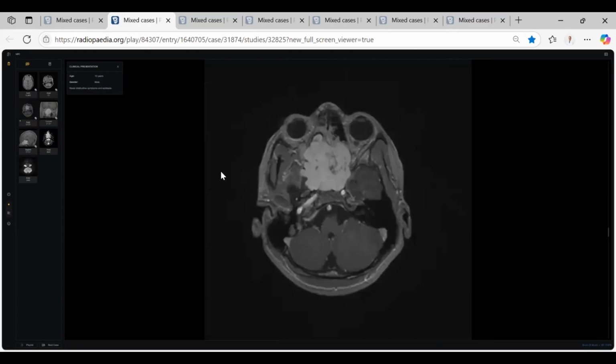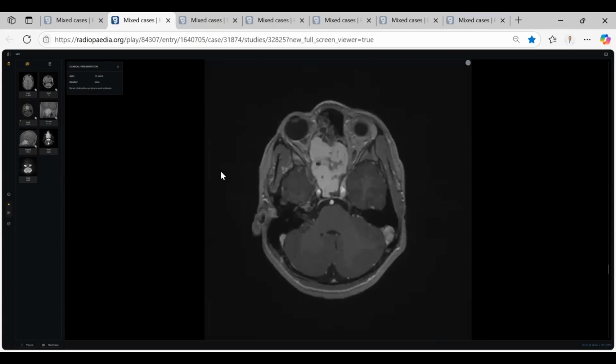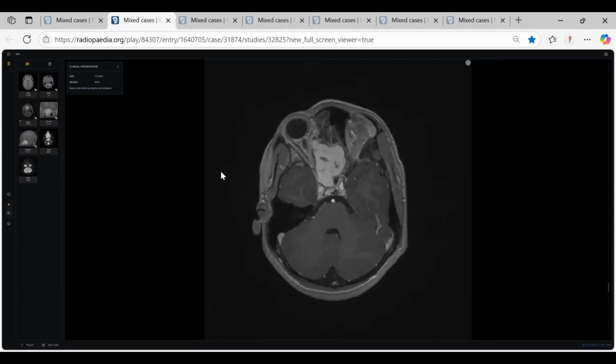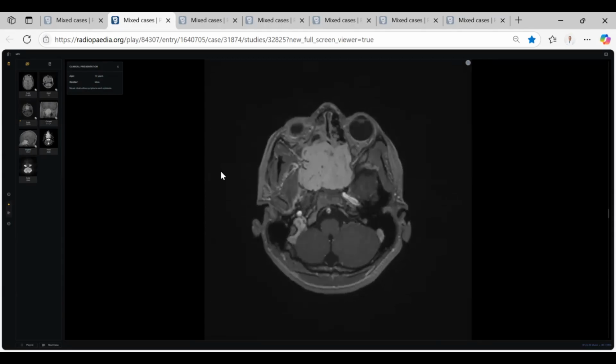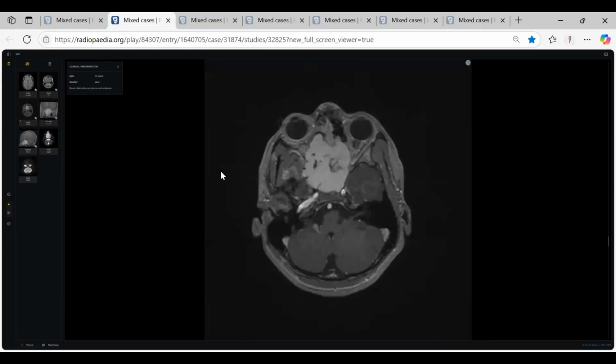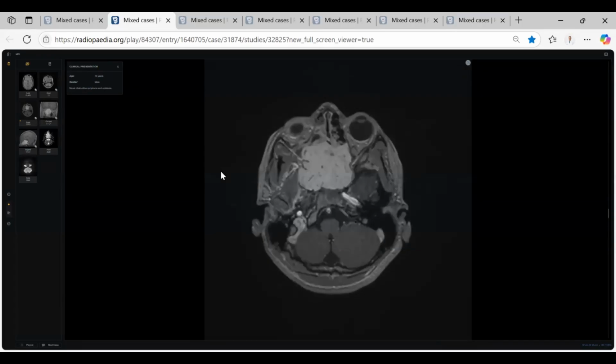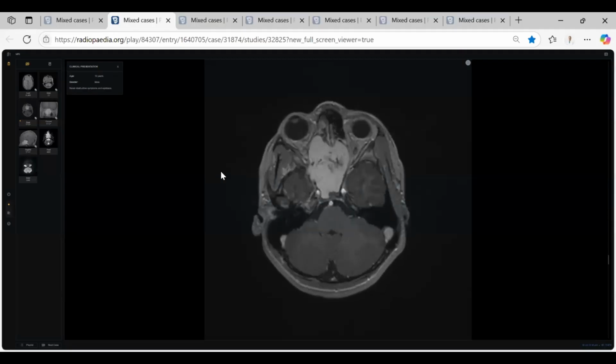Don't insinuate yourself into too dangerous a description. It is better to say that it is extended to the nasopharynx. Very easy. See, doctor, tell me first, what are you thinking about, before you describe, what is the differential diagnosis for this case in your mind?